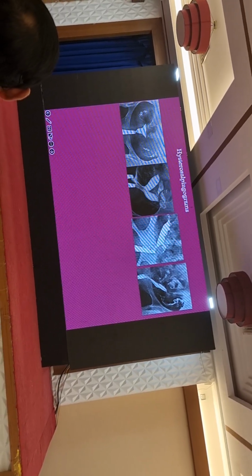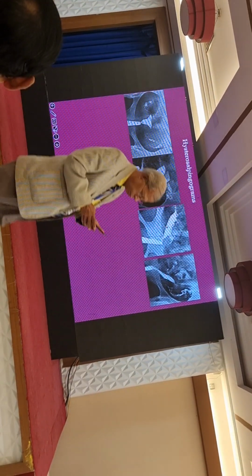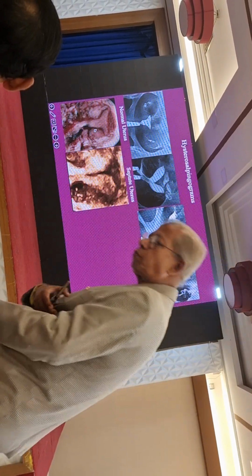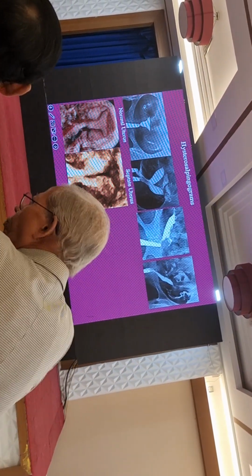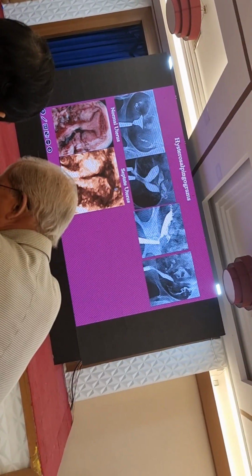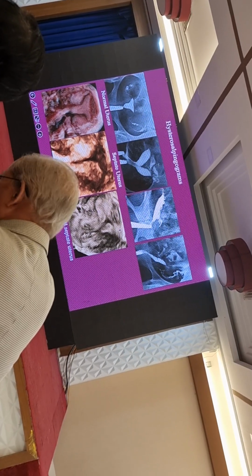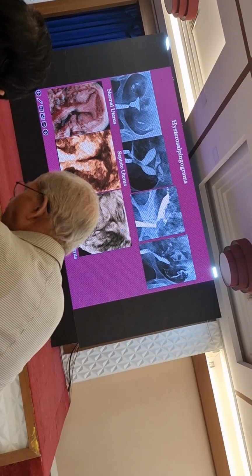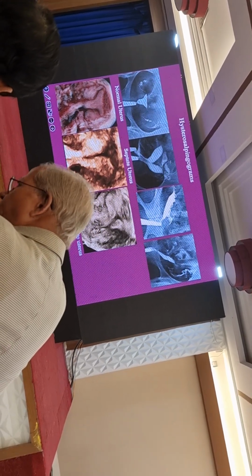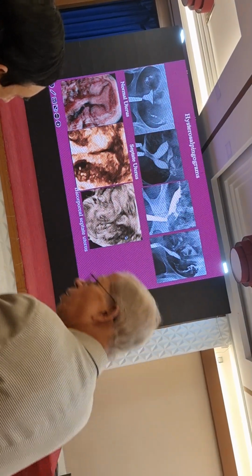this actually I very recently did. And this looked like a didelphys uterus. I was pretty confident. I said, okay, let's go ahead and do a 3D and see what happens. So, when we did a 3D image, the coronal plane shows a normal fundal contour. So, this was a complete septate uterus, and not a bicorporeal uterus, because the fundal contour was normal, but the 2 uterine cavities were far apart.